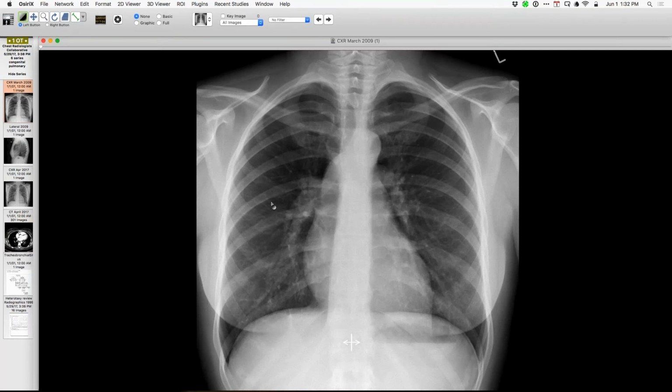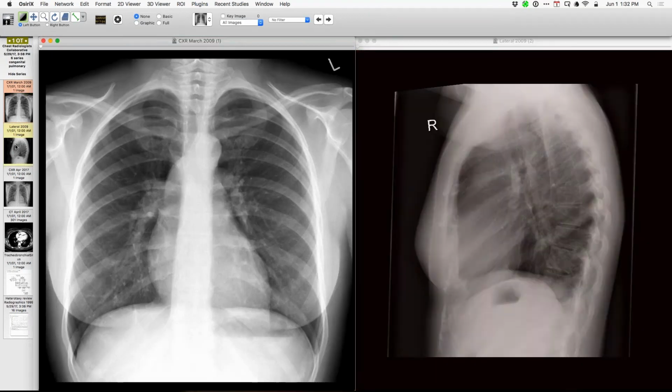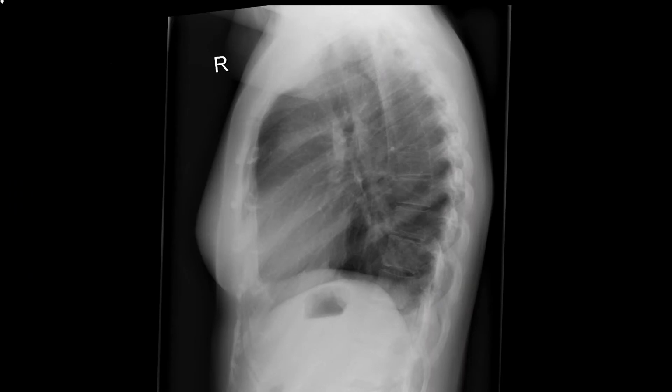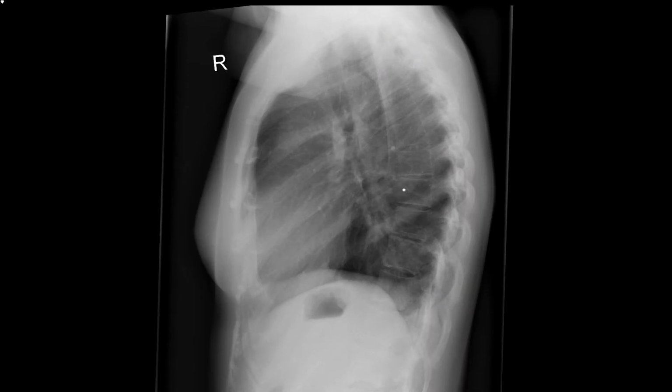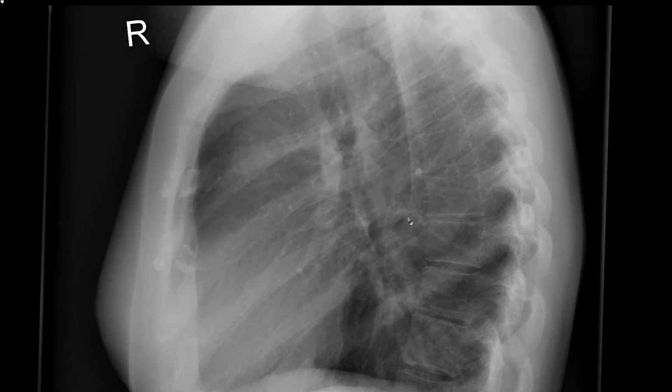And this is a cute radiograph to test those observations on. That's kind of cute, I think. Little subtle findings. You have a lateral view. Sometimes you can see the hyparterial bronchial arrangement on lateral view too. So there's not much pulmonary artery in front of the left main bronchus there.